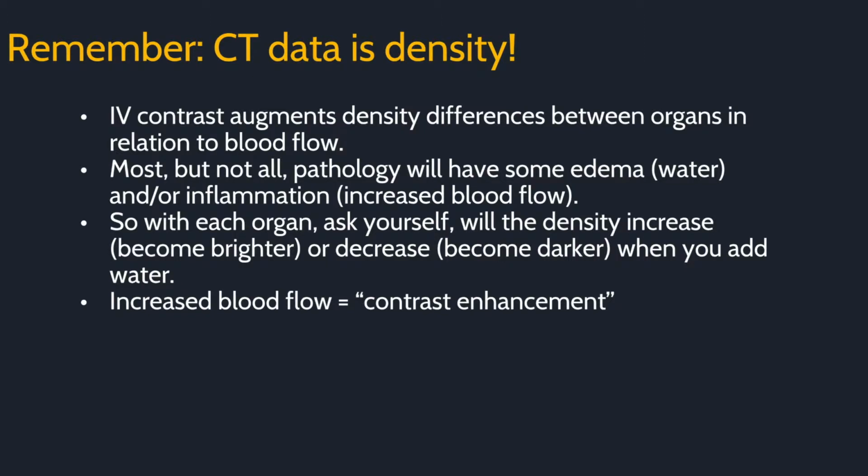Remember, CT data is density. If you know that concept, you can work your way through much of a CT. Most pathology will be associated with some amount of edema or water, so with each organ, you can ask yourself, if I add water density to this, will it get brighter or darker? Most pathology will also have some inflammation or increased blood flow.